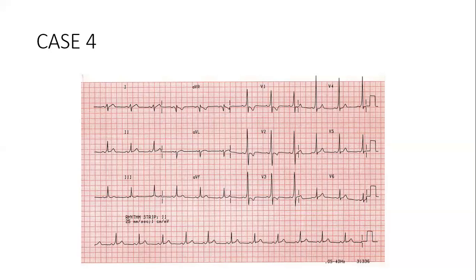I think you were correct, but trust your answer. So what is it? Hi, Doc. Hello. It's Madonna. Hi. I see delta waves on this ECG. So I think it's Wolff-Parkinson-White syndrome. Yes. Correct. Beautiful. So what is that? What is Wolff-Parkinson-White syndrome?